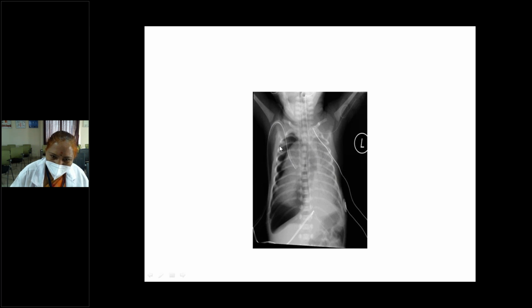What is this tube? Intercostal tube. Intercostal tube drainage usually will be put in an underwater seal. Okay, this is an intercostal tube. Also, you are able to see. So, what is your diagnosis? Grossly shifted mediastinum towards the left side. Yes. Okay. This is the collapsed lung. This is a collapsed lung with mediastinal shift towards the left side. So, what is your diagnosis?